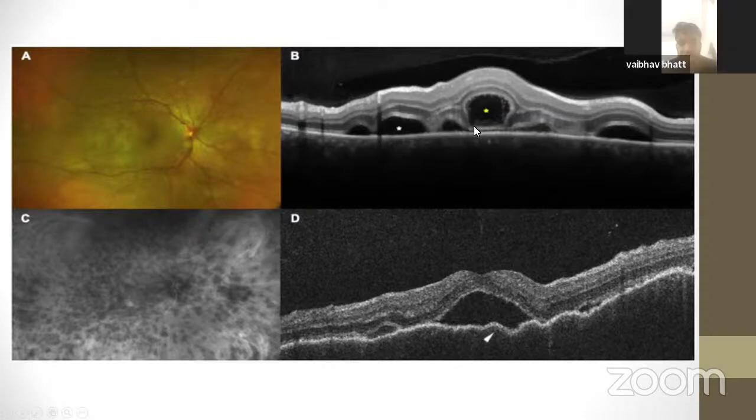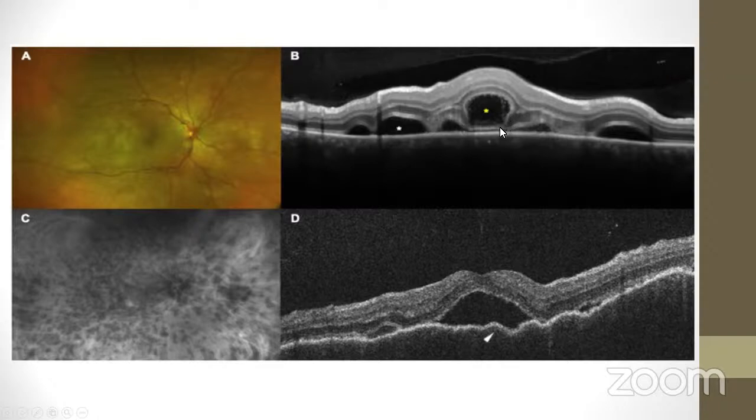So this yellow area is between the outer and the inner photoreceptor layer. And that is why you have these, maybe part of the photoreceptor bodies which have been stretched. This is because of inflammation or bacillary layer detachment that we get this yellow space. Whereas the space marked by white is basically the subretinal space, where the retina is lifted off. So it's more like a neurosensory detachment, the white one. Whereas the yellow is more like a bacillary layer detachment, where there is a split in the outer retina between the inner photoreceptor layer and the outer photoreceptor layer.